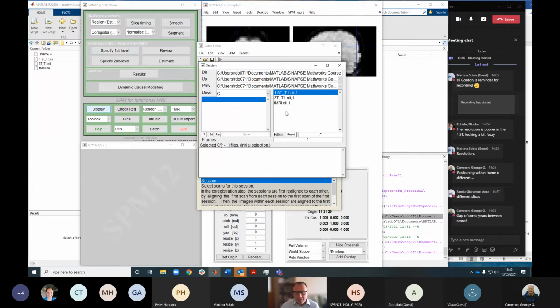So we've got 3 files here, the 1.5T image, the 3T image, and an fMRI image. You'll notice they've got a comma and then a 1 after them. Nifty images can be packaged in different ways. You can have a 3-dimensional image, like we have here, with our 1.5 Tesla scan or our 3 Tesla scan.